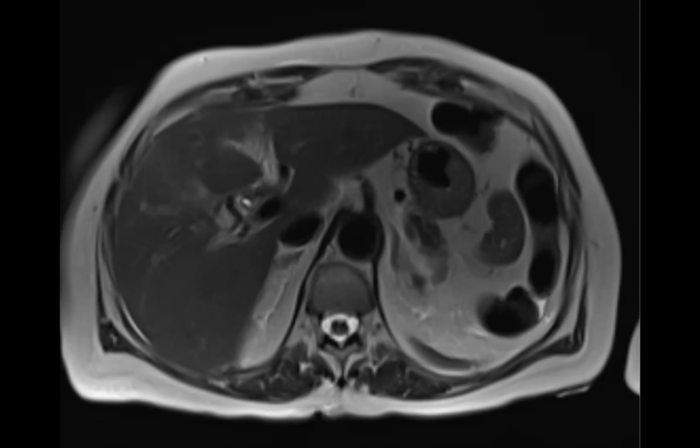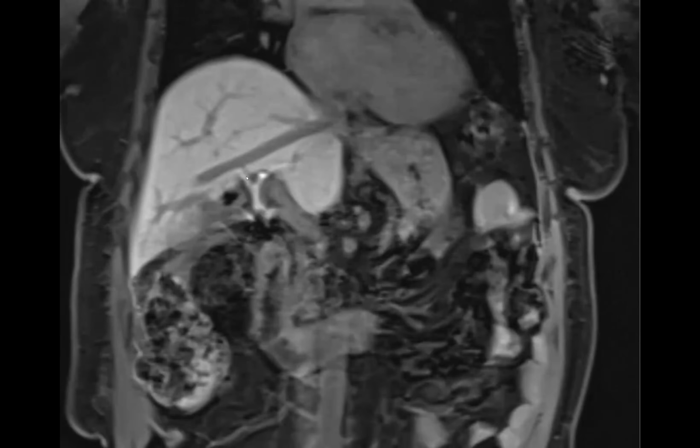Yeah. And it's always really, really good to communicate with the team to see what their level of suspicion is. And they were like, bile is pouring out of this drain. We know there's a leak. We want to see what the level of the leak is. And we were like, oh, we don't see it, but we'll keep the Eovist scan going. And then we finally saw it. And then we were able to tell them, oh, there's a nice confluence here, so you've got a good area that you can anastomose to. It wasn't so high up here where it's more complicated.